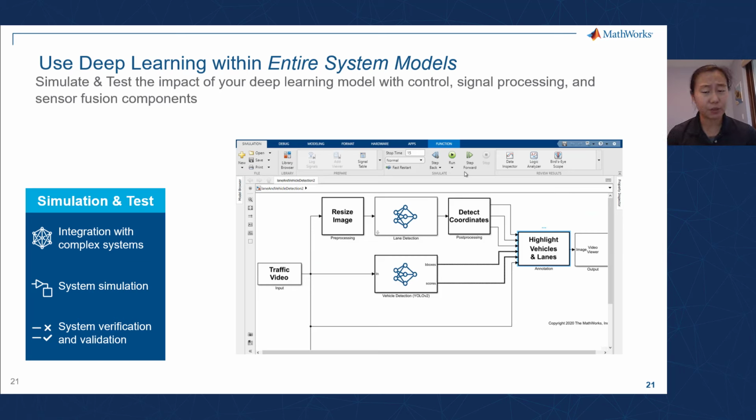We definitely have no time to talk about this specific example today, but there is basically a fourth step in the AI design workflow, and that is simulation and test, right? You don't go straight from training an AI model to sticking it on the robot or the device itself. There is a set of tests that you do need to perform or integrate your model with the larger environment that you need it to perform in. And so that's something that you can explore further on. I can include some links to those particular tasks.